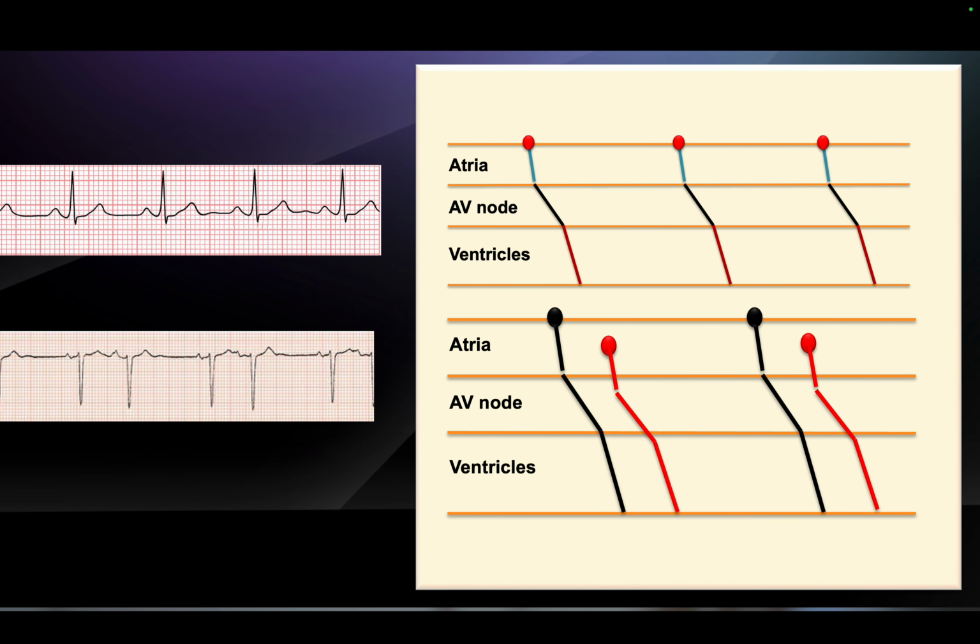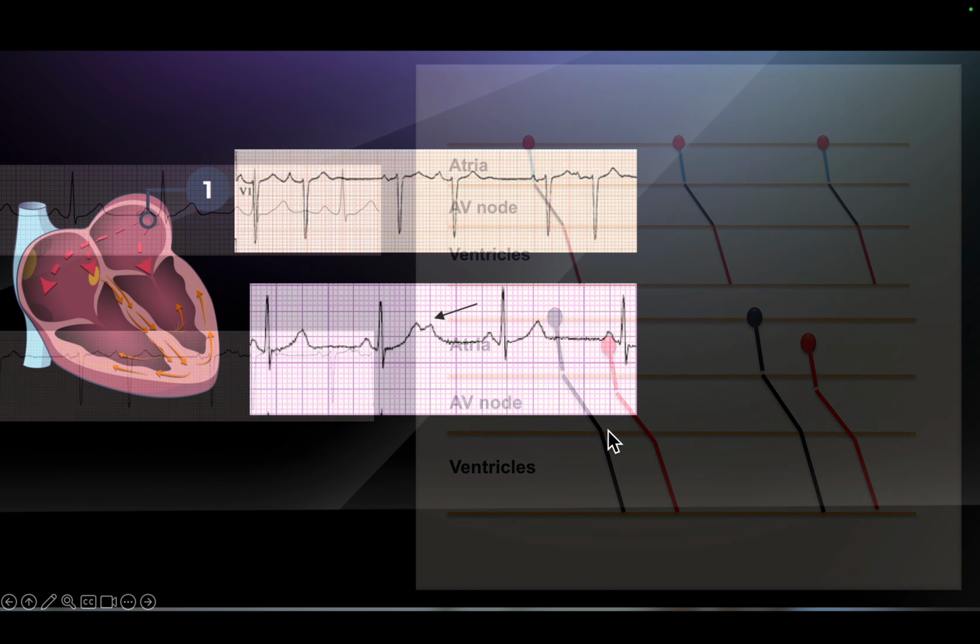We have something called a ladder diagram. I think I have shown that in my YouTube video on arrhythmias. It would be a good idea to go through that video also for the basics of M mode. Here we describe the atria, that's the sinus node. From there is atrial conduction, there is a delay in the AV node, and then the ventricle. In normal sinus rhythm, everything happens normally: SA node, atria, AV node, ventricle. When we have an atrial ectopic, there is an ectopic focus which fires prematurely, then the sinus beat, and then it is conducted down and produces an abnormal P wave, because it's an ectopic, and a QRS complex. That's the classic atrial ectopic.